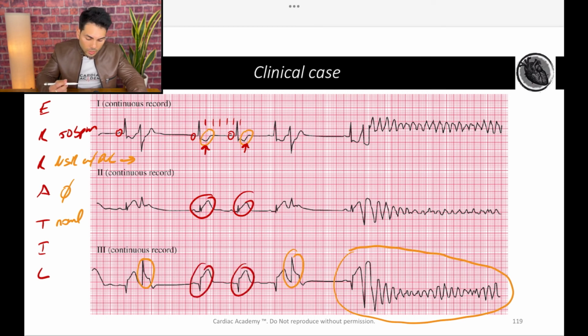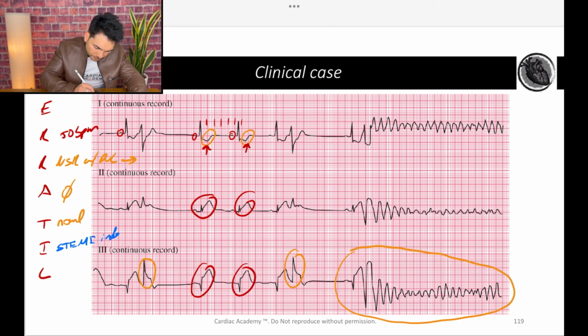ST segment elevation myocardial infarction, and we're also seeing some reciprocal changes in the lateral leads. We only have evidence of lead 1. And so let's say we have a STEMI here. And it's in the inferior leads, so inferior MI. And then chambers, we can't really assess for the Sokolow-Lyon criteria or the Cornell criteria, or whether there's an axis deviation, even though it seems like there's not, but we can't really assess.